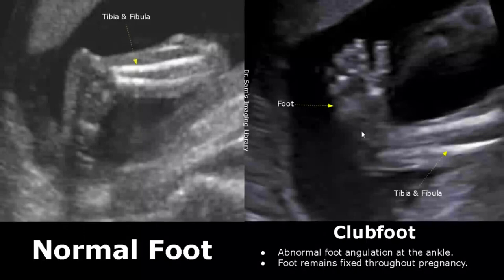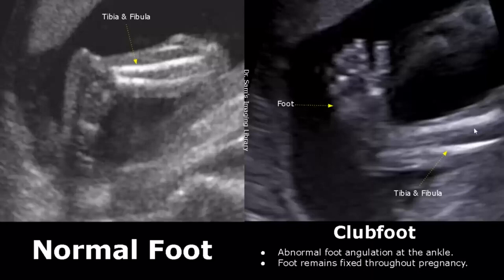Clubfoot refers to a condition in which there is abnormal angulation of the foot at the ankle relative to the tibia and fibula. Normally, the ankle and foot must look like this. This is the proper alignment of the foot, whereas over here it appears curved at the ankle region. The foot often remains fixed in this position throughout the pregnancy.